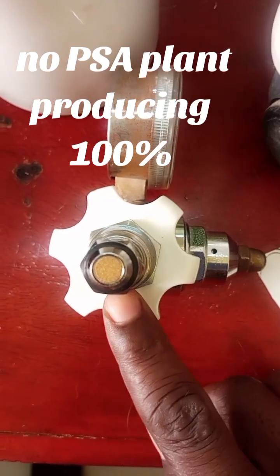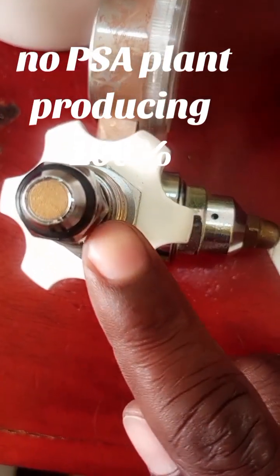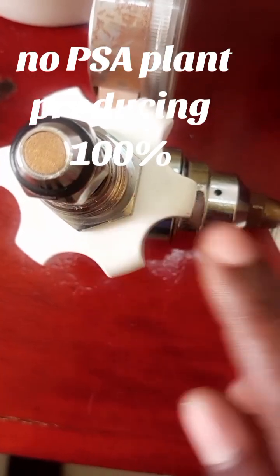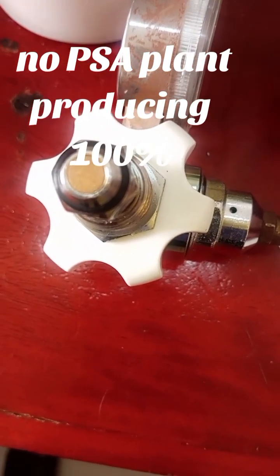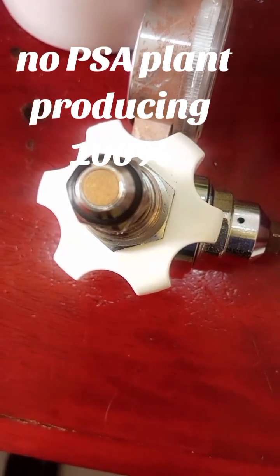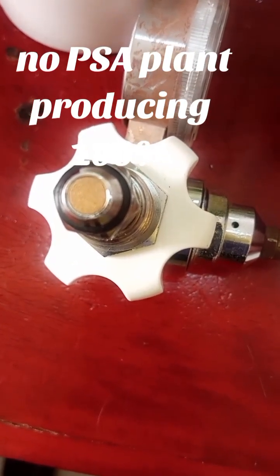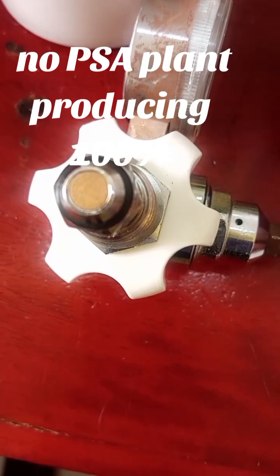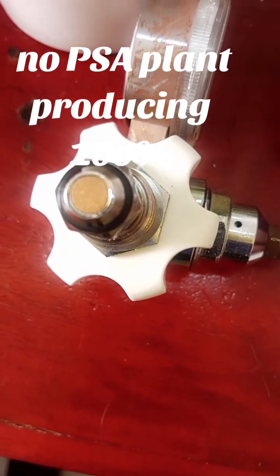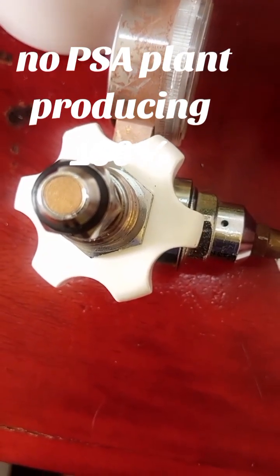And this is the O-ring. The black one is the O-ring, which is just to prevent any leakage of the gas. In some circumstances the O-ring, the black one, may get worn out, so you need to replace it to prevent gas leakage from the gas cylinder. Otherwise, you will create a very dangerous working zone in your work.